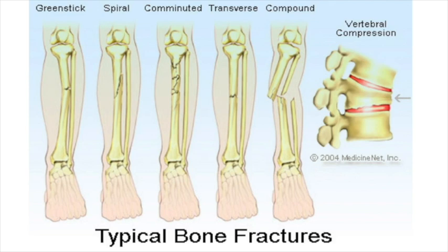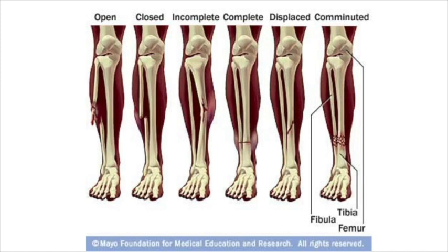Also, you have vertebral compression or vertebral fracture. This is a sample of another classification: we have open fracture, closed fracture, incomplete, complete, displaced, and comminuted fracture.